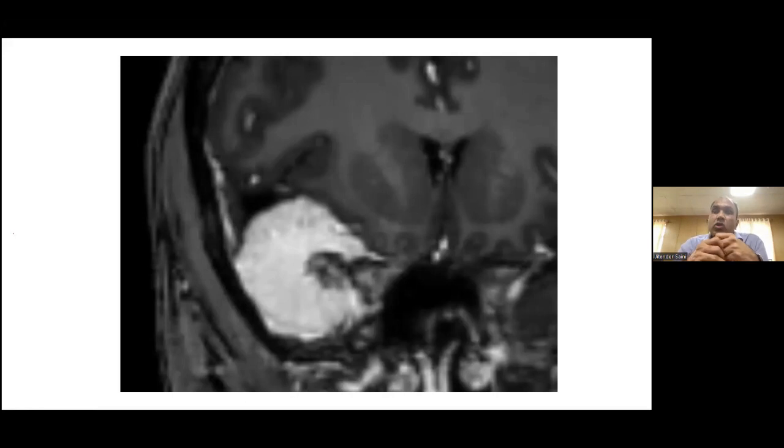And usually also look at how the bone changes are there. Here you can see the bone is there. You can see the bone. This dark black thick line here is the bone. The lesions which are slow growing, for example meningiomas, or the intraaxial lesions also, which are very slow growing, will start causing erosion of the bone, smooth erosion of the bone, without causing any destruction, causing a mass effect on the bone. Whereas those which are rapidly growing lesions will either invade the bone or destroy the bone. They will not be remodeling the bone because they will be rapidly growing.